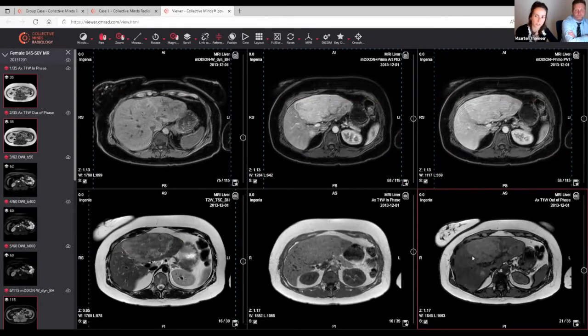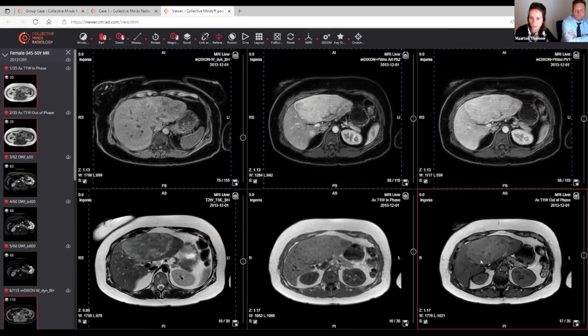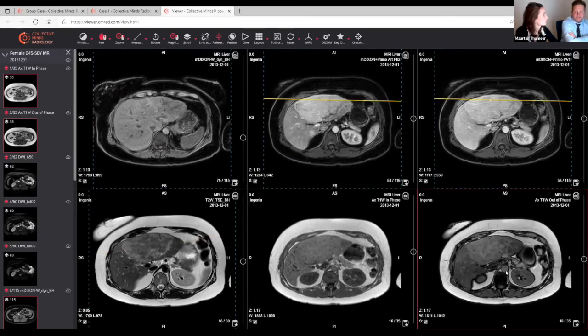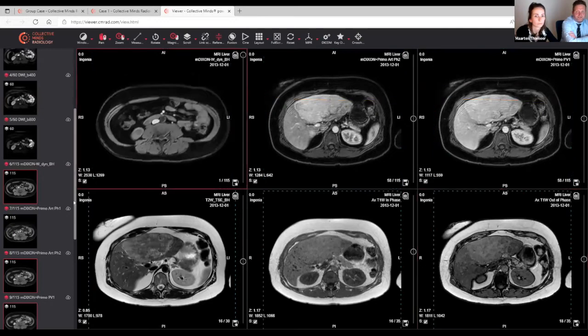Well, and we see some lesions in the liver. I think we will get to them later. This is the biggest lesion we're going to talk about, but are there also some fatty areas? There seems to be some fatty components in the tumor too. Yeah, we will discuss that later on. But first, I would always ask to write down in your report if there's cirrhosis or steatosis, and always start your protocol with this sentence. Okay. But now you have the dynamic phases.